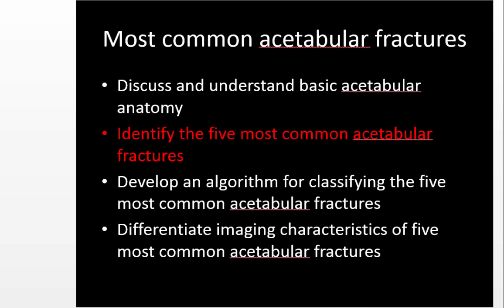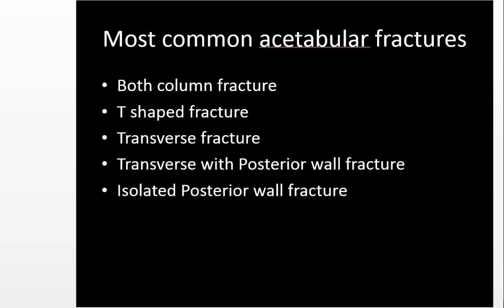Now I want to talk about the 5 most common types of acetabular fractures. Obviously, according to the Judet-Letournel classification, there are actually 10 types of acetabular fractures that have been classified. However, in practice, 85 to 90% of acetabular fractures that you will see are these 5 acetabular fractures, and that's what I'm going to discuss in my lecture today. Because if you master these 5, you can essentially diagnose 85 to 90% of acetabular fractures that you see in clinical practice. So I'm going to focus on these 5 today.